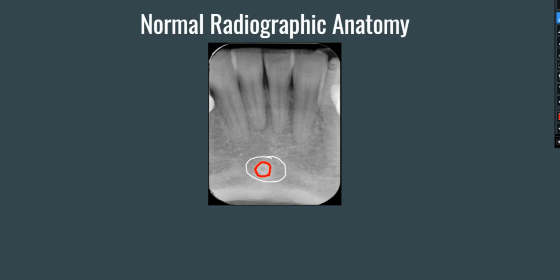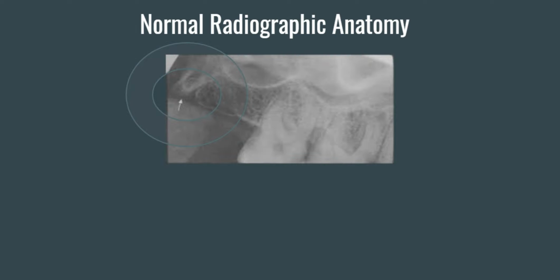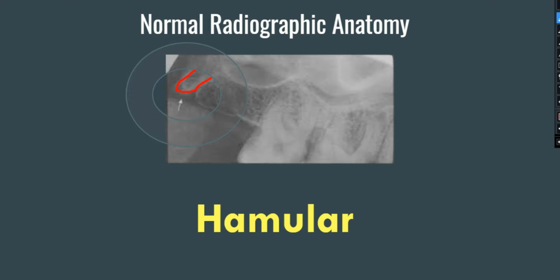That is your genial tubercle. And this hook-like projection, it's right here. Your hamular process, or the hamulus. And that's it.